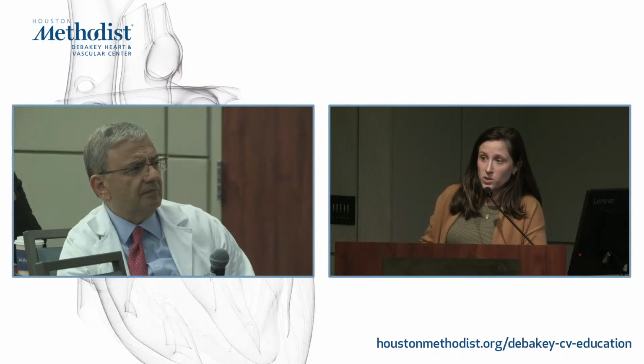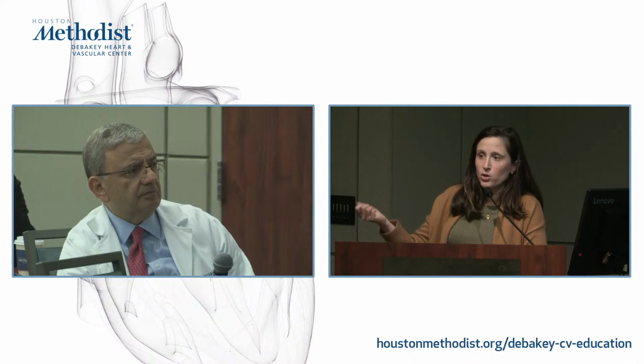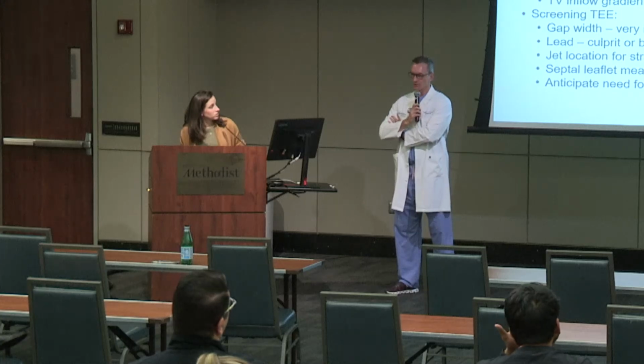But what goes into the decision? Yes, meaning the size of the septal leaflet for the tricuspid clip, or the size of the posterior leaflet for the mitral clip, at your grasping zone. So it can't be anywhere. It has to be where you're planning to grasp. Something else is the gradient. That's not usually a problem for tricuspid because we have a big inflow area. But on the mitral valve, let's say we have a little bit of a higher inflow gradient, then we may think about doing a smaller clip, or if it's a tricky location for placement of the clip.